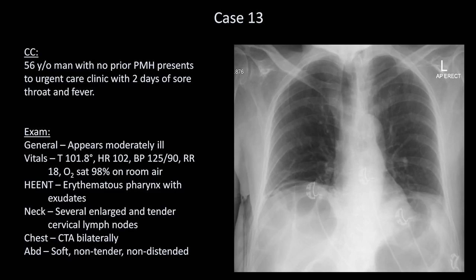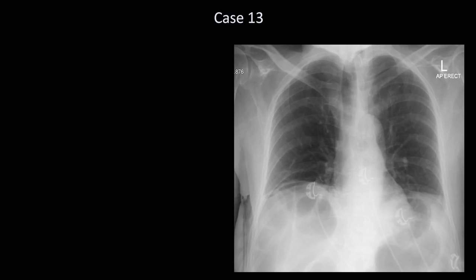So what's going on? Look in the right upper quadrant of the abdomen, where there is obviously a lot of gas. Do you notice these lines here? Those are the natural separations between adjacent haustra in the colon. What's unusual is that there typically is not colon there because the right subdiaphragmatic space is usually occupied by the liver. However, this is an example of an anatomic variant called Chilaiditi sign, in which a loop of colon has become interposed between the liver and the diaphragm.